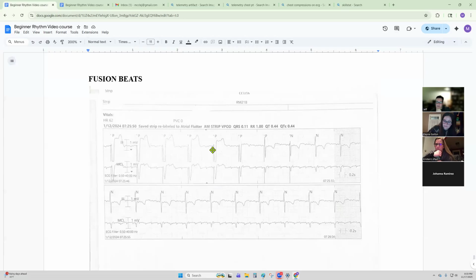So over here, you have a ventricle pacer spike. Over here, ventricle pacer, that is. And because that pacer is directly in the big muscly part of the ventricles, anything coming from the ventricles would be a bigger, wider QRS, just like a PVC, right? So you can see the morphology of the QRS change through here. These are what you call fusion beats.